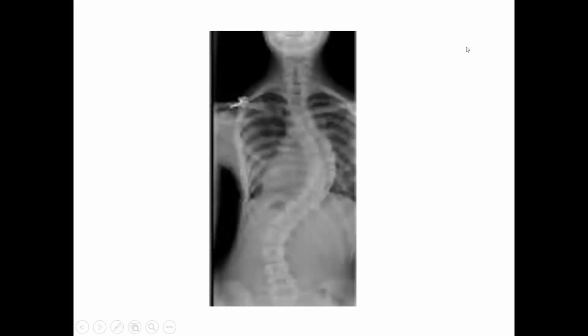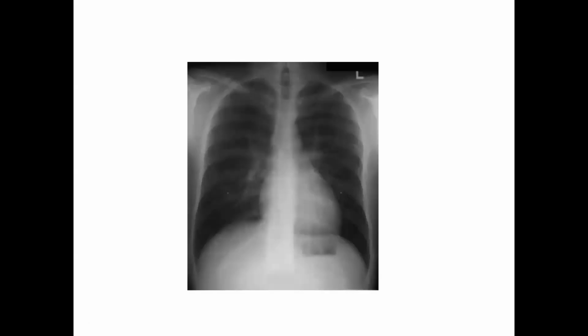This particular patient's got scoliosis. You can see the curvature of the spine. You also can probably imagine how it might be difficult to ventilate one of these individuals, especially if they were to become problematic with the side that's impacted or restricted, if you will, based upon the anatomical alteration of the spinal column. And then we'll finish up with this particular chest x-ray.